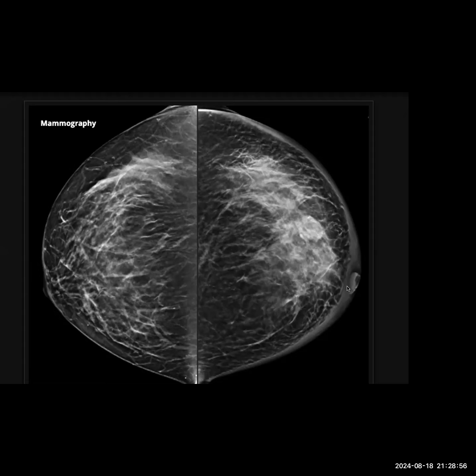Okay. In this case, you could have closed off. I think this could be highly malignant, this is highly suspicious for malignancy, M5 lesion. I would recommend MRI and also ultrasound-guided biopsy. And later on, I would also look at the dynamic sequence in MRI. Okay. So, and also breast MDT. I'm not sure. Did you talk about breast MDT? I talked about one-stop clinic, not MDT. Yeah, you did not talk about the breast MDT. So please do mention all the MDTs wherever it sounds relevant.